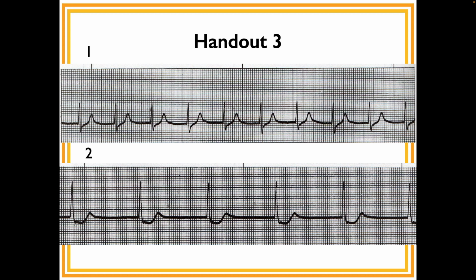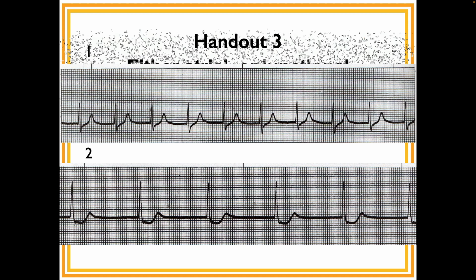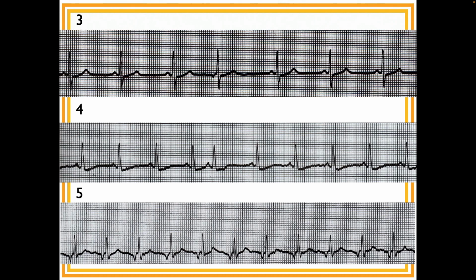Everything you said was perfect. I'm going to quibble a little just because we're in the ECG class. There actually are some P waves, those retrograde ones. Yeah, retrograde. Again, it doesn't change anything that you said. It has no significance other than we're in ECG class. Okay, Abigail, you are next.